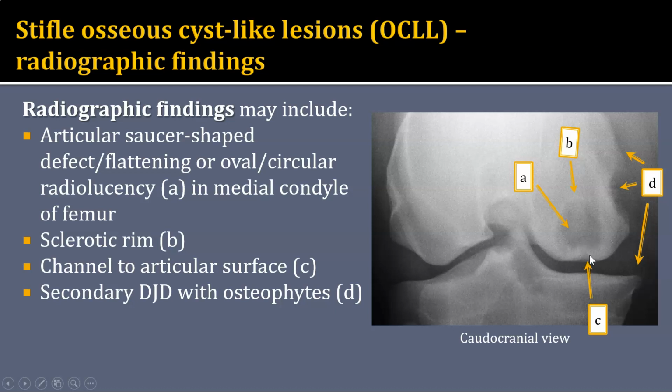So that's kind of a little channel there. These patients not uncommonly do develop secondary osteoarthritis, and on the medial side here, the medial epicondyle of the femur, there are quite a bit of irregular changes of osteophytes. Although this one's a little bit more smoothly marginated, this is extra bone from an osteophyte formation on that proximal tibia.